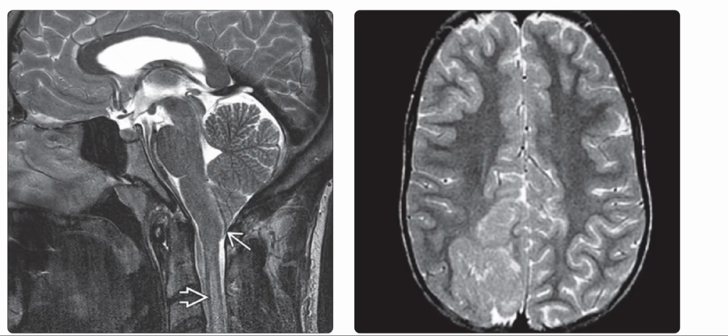In these images, we can see that on the left side, that's the midline analysis of a sagittal T2 weighted MRI. It shows a normal-sized posterior fossa. The cerebellar tonsils are pointed and displaced inferiorly, almost 1 centimeter below the foramen magnum. Note the cord hyperintensity, which is suggesting a pre-syrinx state in this case of classic Chiari 1 malformation.